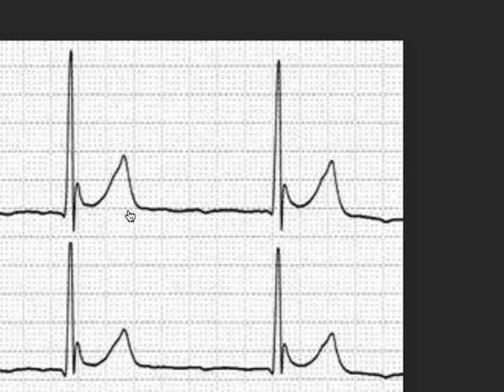Now, it is also called a camel hump because it's like a hump. They are also called a hypothermic wave. So, remember, J waves or Osborne waves are seen in patients when they are suffering from hypothermia.